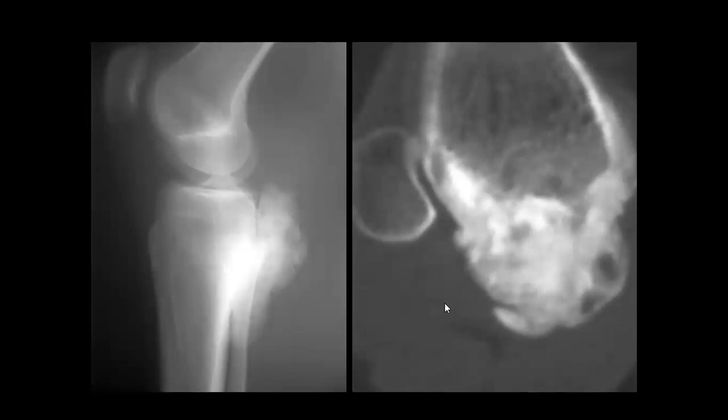Now your question is: is it a bone lesion, a soft tissue lesion, or a joint lesion? So it's not joint, so soft tissue, maybe, but is it a bone lesion? Yes. So it is mixed, part of it is in the bone, but that part is not very clear. In the CT, you can see clearly that it is coming from the bone, right? So nice. One of the best differentials you put is Parosteal Osteosarcoma.